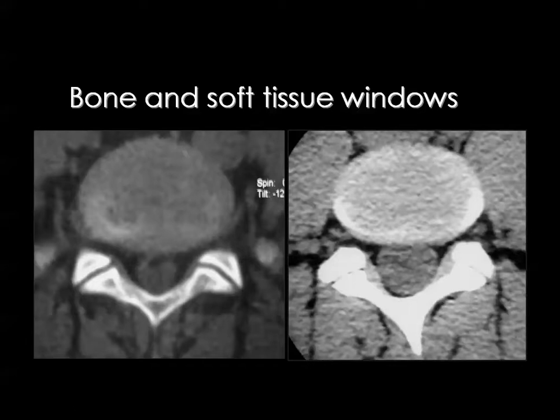And these are the spinal images or the scans, which should be obtained in the soft tissue window setting as well as in the bone window setting. Whenever we are evaluating the spine, we usually ask ourselves what we are going to evaluate, and is this part a bony part or a soft tissue part.